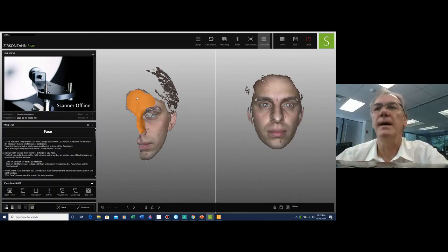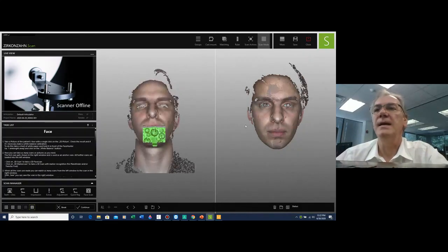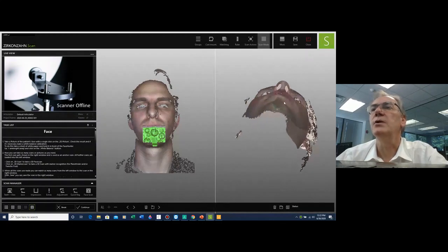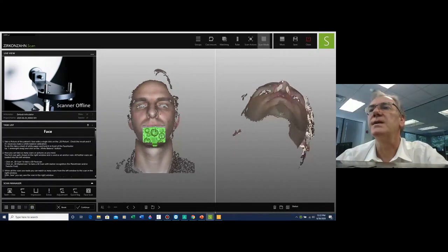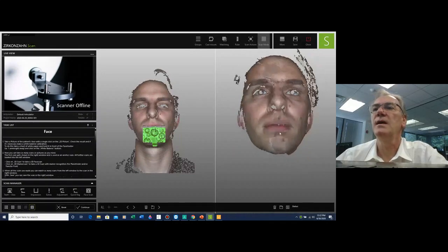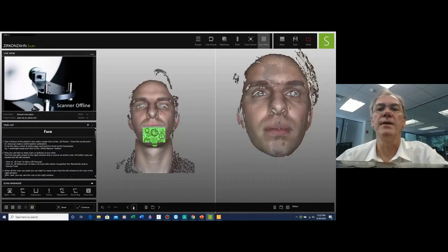And by connecting two dots in that area, the image shifts over and it basically matches. We check it out by seeing if there's any overexposure of the image itself. And we usually check that the design of the nose falls perfectly in position. So we can say that this image here has matched very, very well.